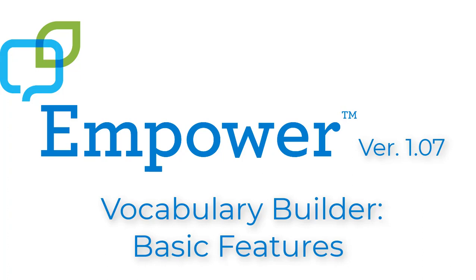Empower version 1.07 Vocabulary Builder Basic Features.